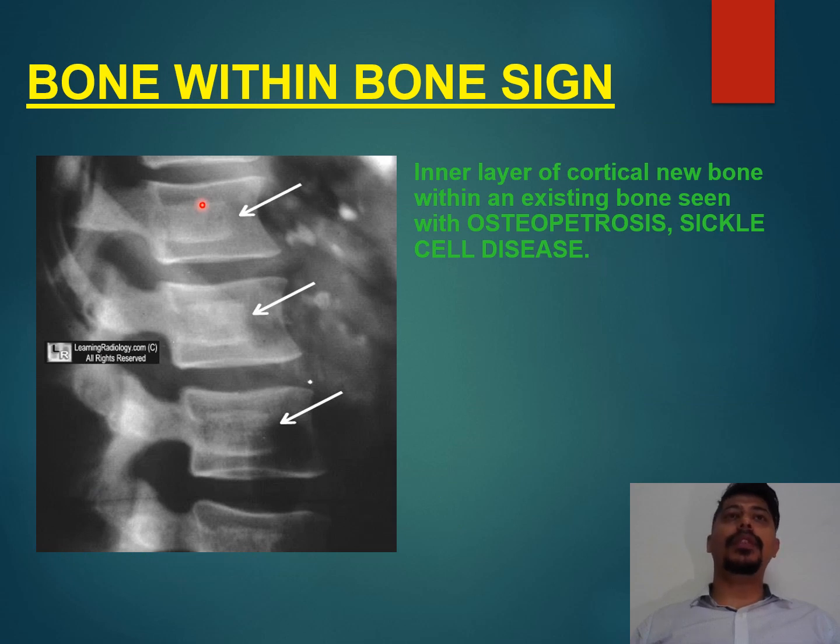Bone within bone sign. We can see the inner layer of cortical new bone within a pre-existing bone, seen in osteopetrosis and even in sickle cell disease.